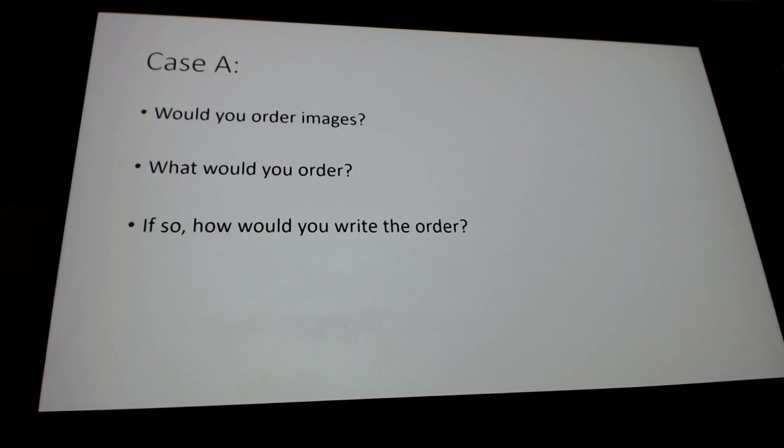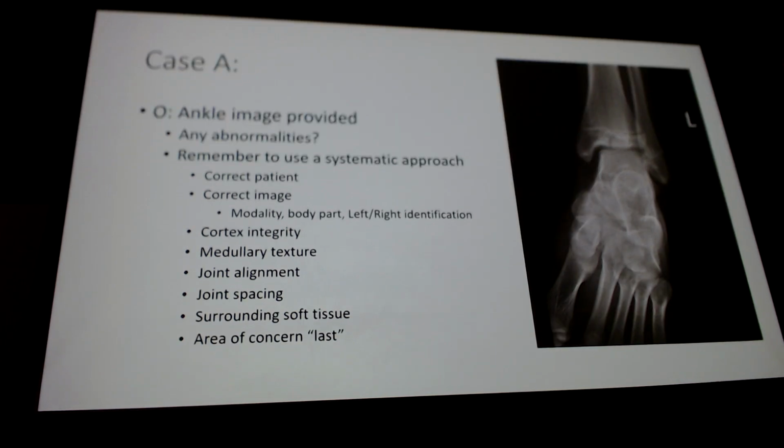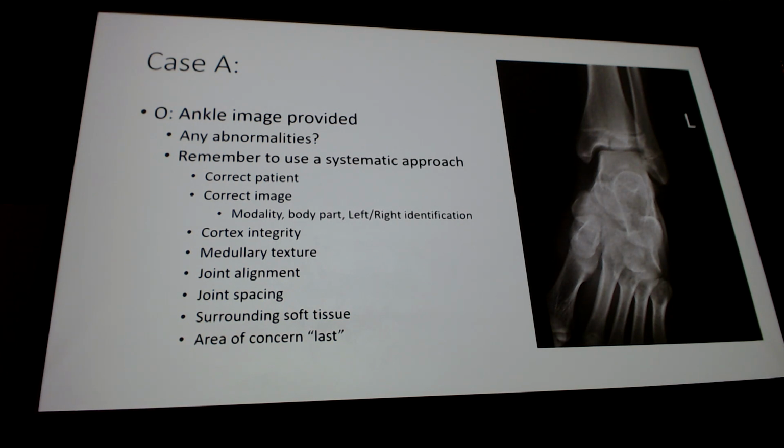Where did it hurt? Tell me where it hurts. Right? If it's all over, then you just put diffuse ankle pain. Just let them know it hurts everywhere. But if she's point tender in that anteromedial area, that's what we're going to do. Okay. Here's your x-ray. This is the part where I shut up and you guys scroll through your image and do your stepwise process.